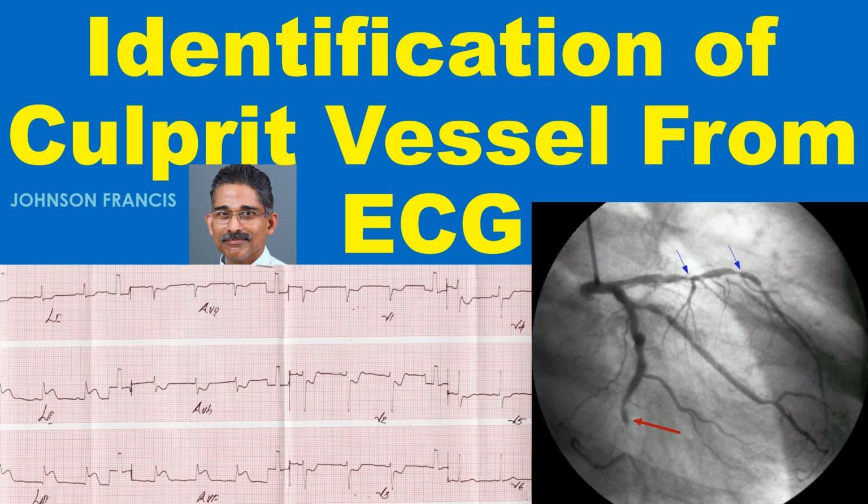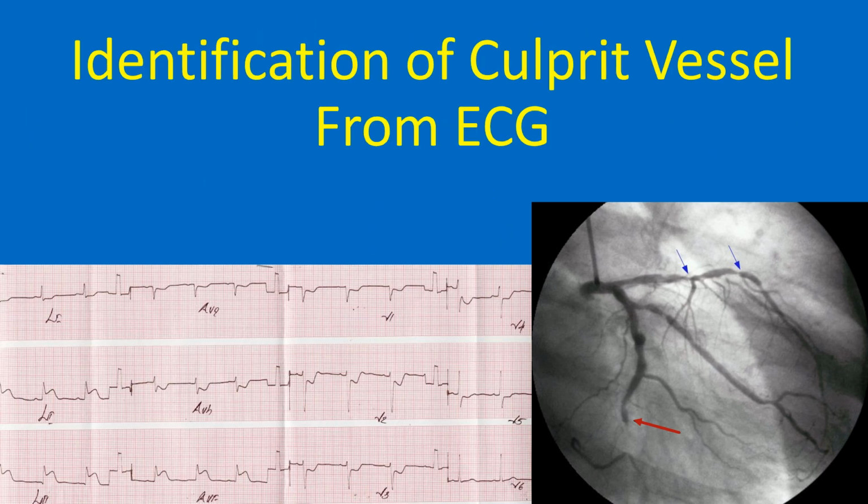Discussion on identification of culprit vessel or infarct artery localization. Have a look at this ECG and the associated angiogram. The ECG shows ST segment elevation in leads 2, 3 and aVF of about 3 mm.